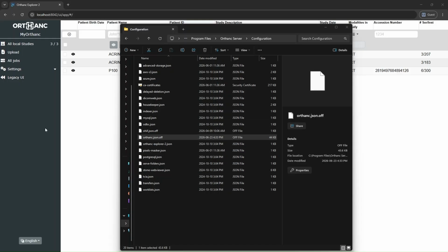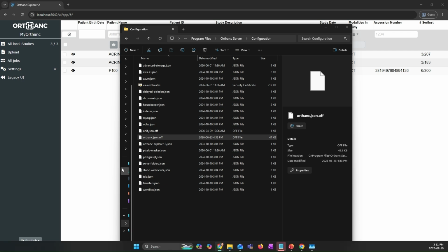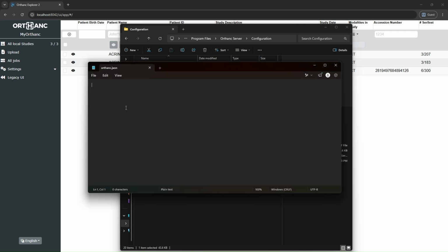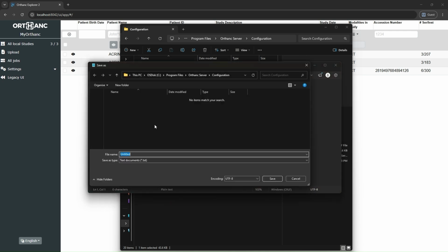Now, in a second, my Notepad's going to open. There we go. And that's fine. Now, we don't want that one. So what we're going to do is, and it's actually correct, it says Untitled. That's what we want. We want to create a new file. So what you're going to do here is go to File, Save as, and in a second when my menu pops up, we are going to call it orthanc.json.